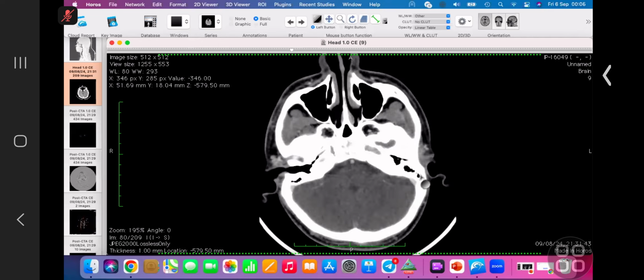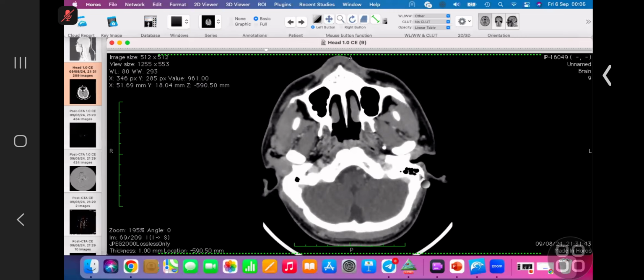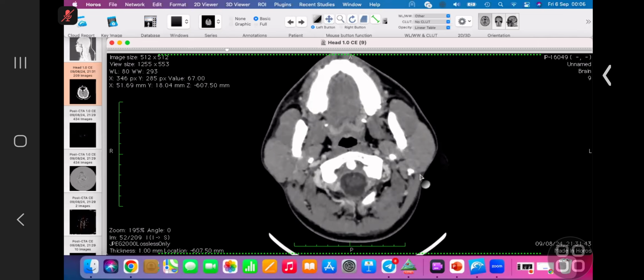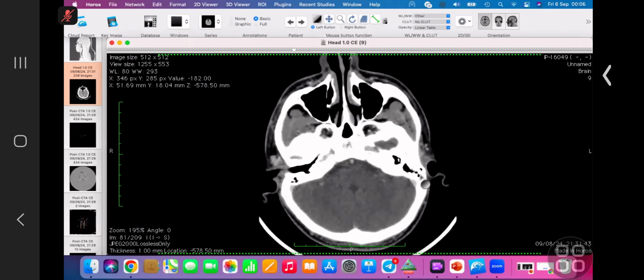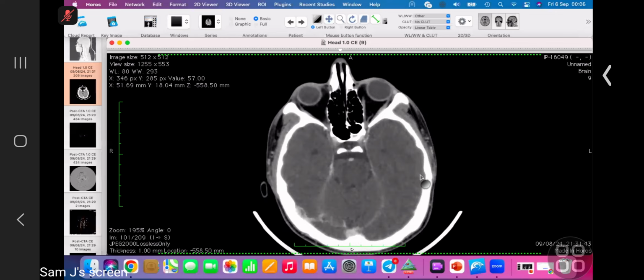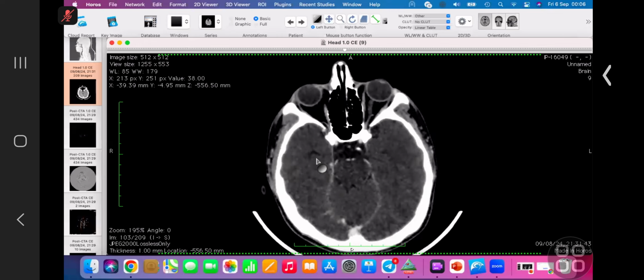So in a young patient who presented with right lower limb weakness, sudden onset, so what do you think? The window is a little bit bright. Actually, I cannot define any absent non-opacified vessels. Should I adjust the contrast? Yes, please. Is this okay?